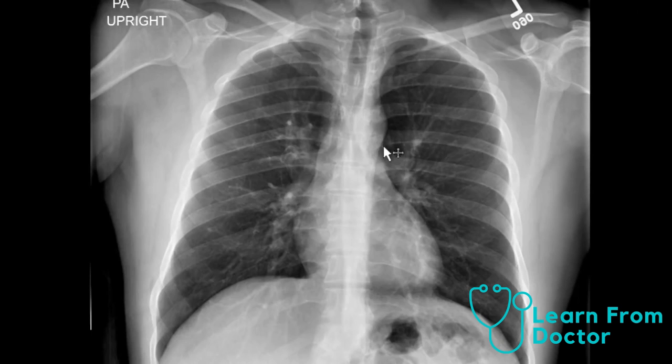Really pay attention to this AP window here just below the aortic knob, because you can have nice little enlarged lymph nodes or masses that like to live in this region. Same goes for the right hilar and left hilar region as well. You can find a nice mass in there that'll bow this out subtly. Then what I do is I follow my mediastinal border on up as well.